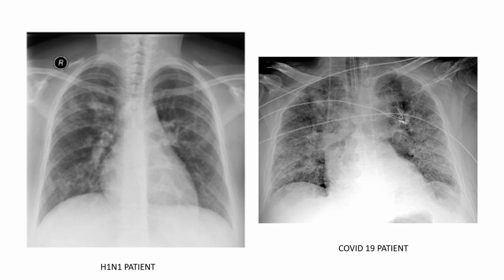And so when we're looking at these pneumonias, and infections, you're going to see a lot of these ground glass opacities. So both of these are viral patients. This is the H1N1 patient over here on your left. And then over here on your right is a COVID-19 patient. And so you sort of see how hazy ground glass, how speckly these patients are.